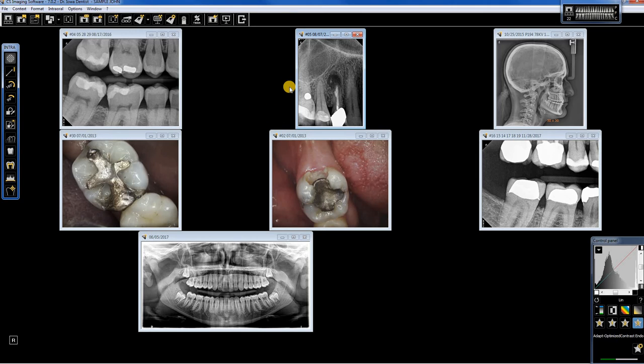All right, and so that's about it. I'm going to make another video again on creating and editing formats, and then we'll dive into editing individual images and using CS Adapt software on the intraoral X-rays.